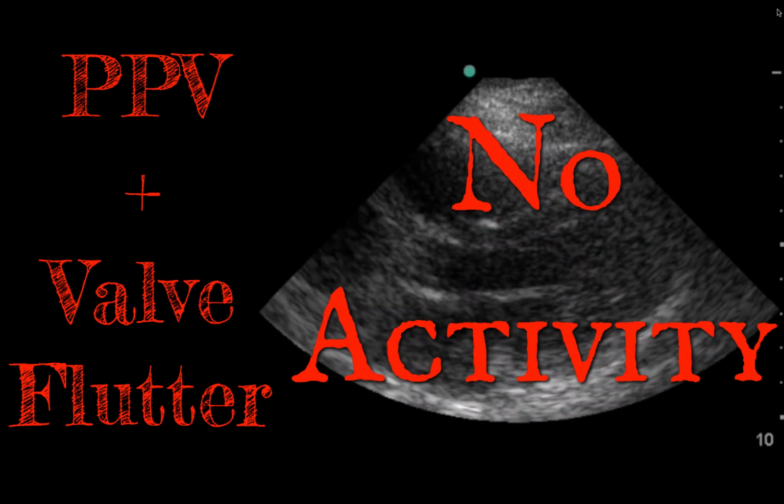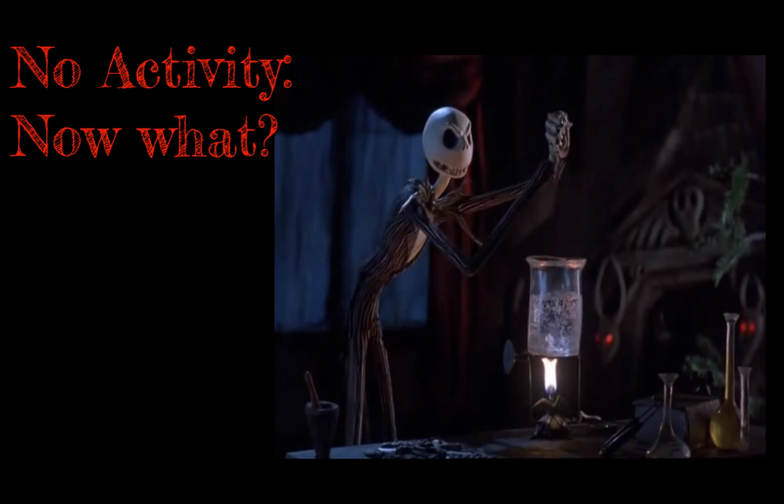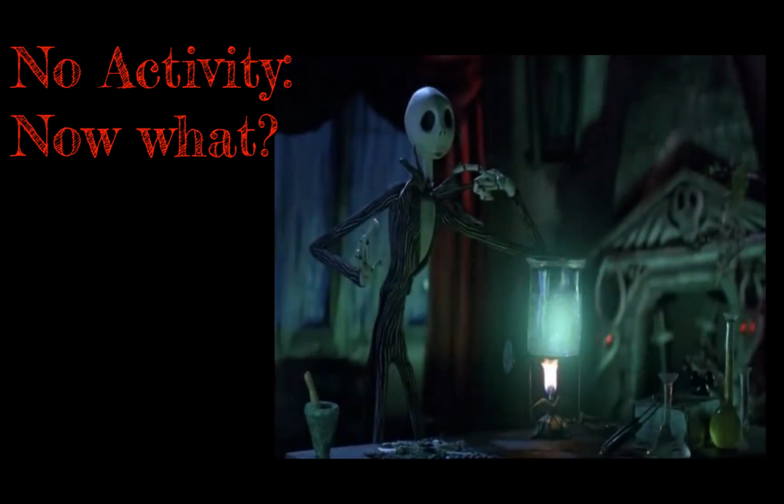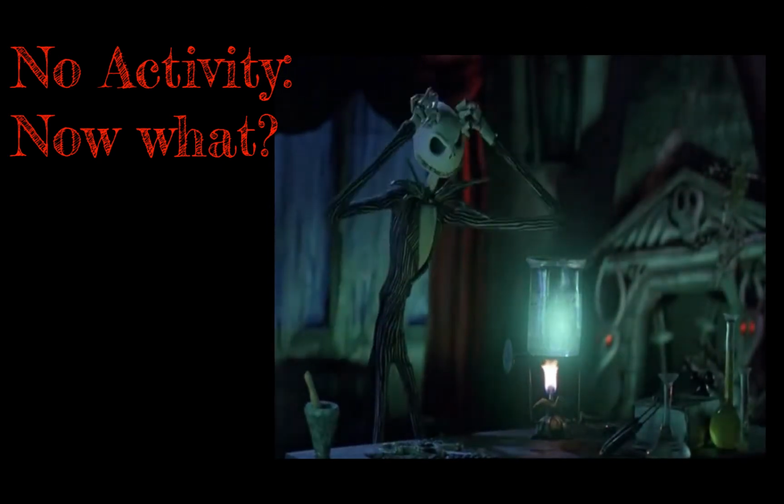Remember that one bit from Nightmare Before Christmas? Interesting reaction. But what does it mean?